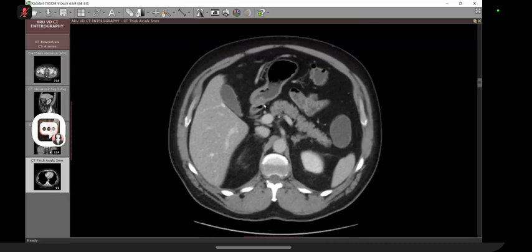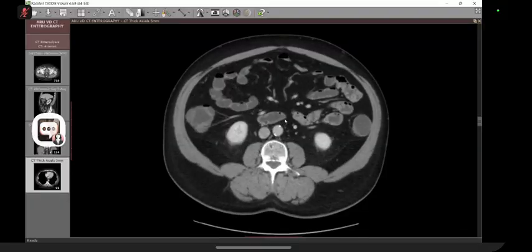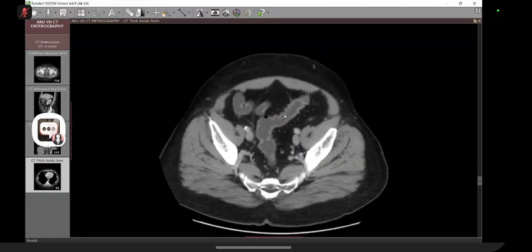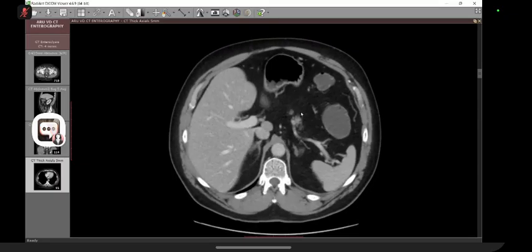So let's go through CT of abdomen. Now, the one which I have selected for you, for teaching purposes, it's easy because I have selected a case in which there is a lot of abdominal fat. Fat is our friend on a CT scan, and fat is our enemy on an ultrasound scan. Because if there is fat, it is horrendous. On an ultrasound scan we cannot pick up things, and we always write a disclaimer: suboptimal study due to patient's BMI, high BMI, etc.